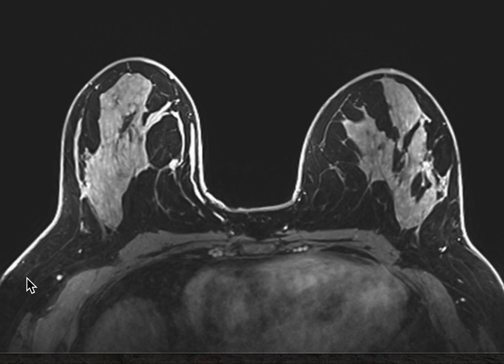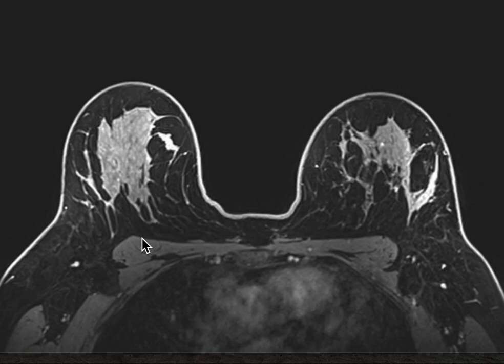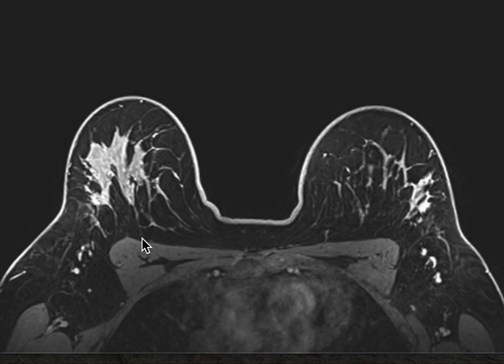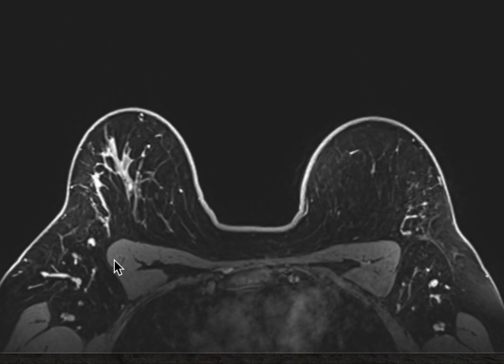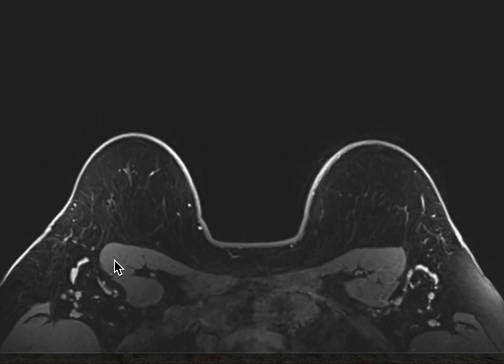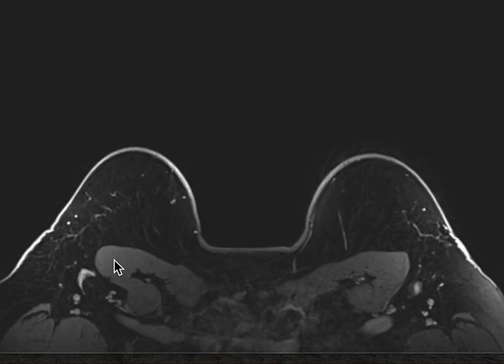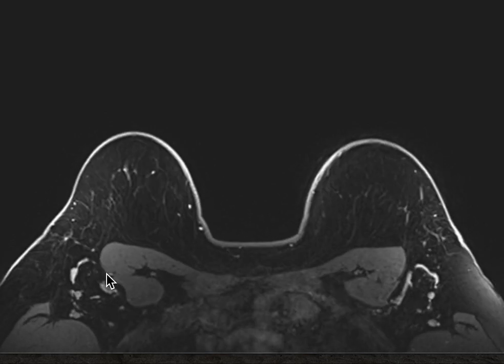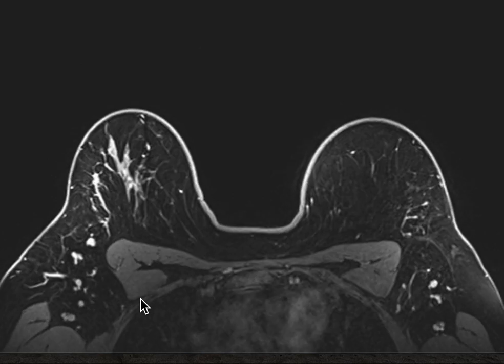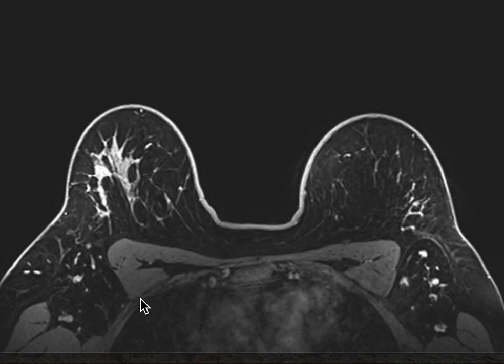Right lymph nodes, axillary lymph nodes, and there is quite a large variety in terms of right and left, I mean, in terms of normal lymph nodes. So sometimes you look at the right and you might say, oh my gosh, it looks enlarged, but then you look at the left and it looks pretty much the same. I'm not talking about super enlarged, like obviously metastatic. I'm talking about a little bit. Sometimes it's hard to tell if it's abnormal or not. But so I go right axillary, left axillary.